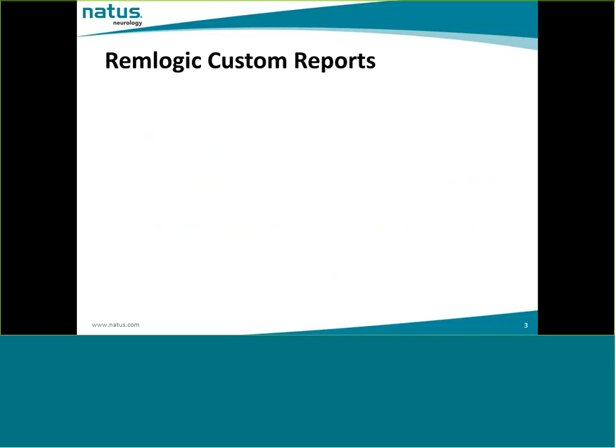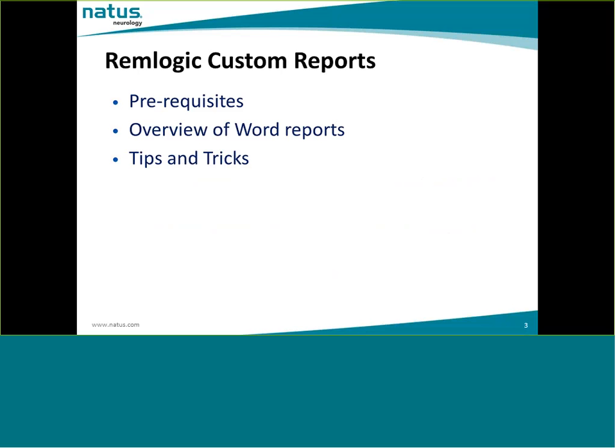So the first few things that we're going to go through are the prerequisites, the overview of Word custom reports, and the tips and tricks in customizing the RemLogic reports.